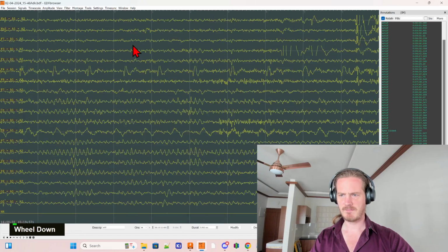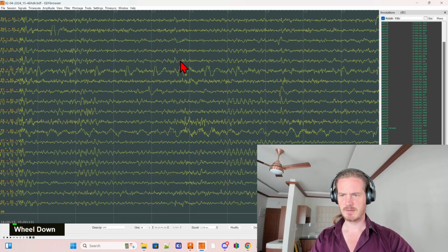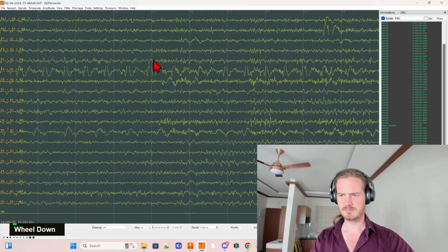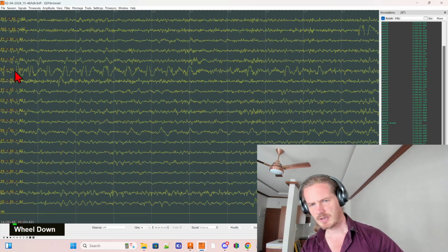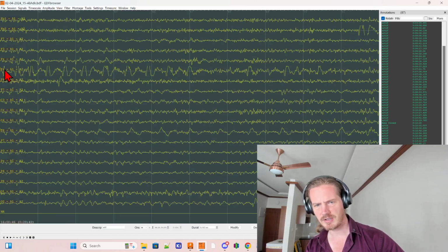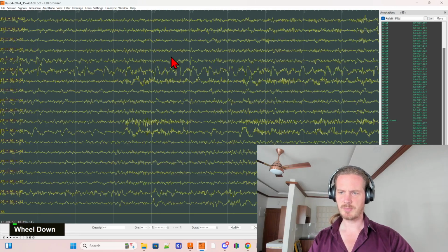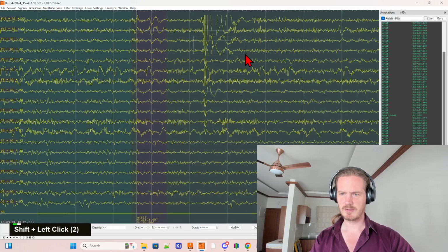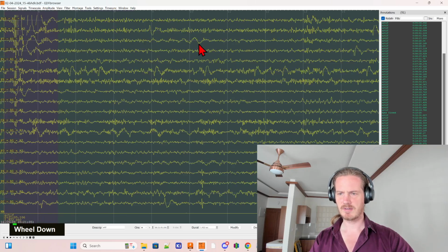This thing over here. Oh, we're definitely removing all of this. And this. Keep in mind, all of these issues are on F4. So in a bit we're going to see the report, and let's take a look. My prediction is that F4 will be less connected compared to the other electrodes. We'll have a lower connectivity, lower coherence.